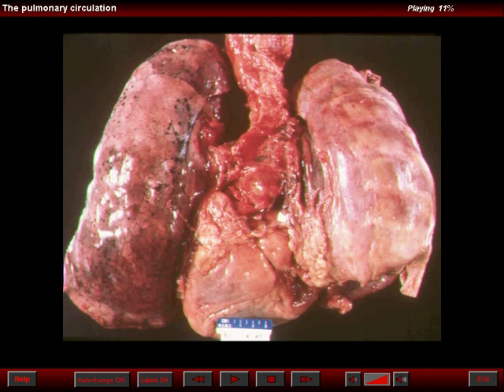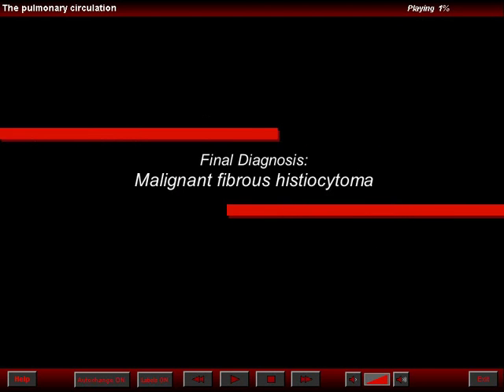The patient died shortly after the MR examination, and at post-mortem study, one can see a photograph from behind a small right lung, a mass at the bifurcation of the trachea and in the right hilus as well. The histological diagnosis of this mass was malignant fibrous histiocytoma.